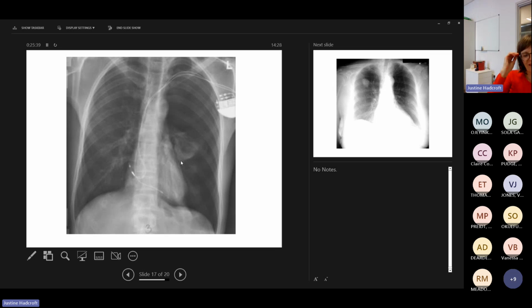What about this one here? Coming to the end now. I think we've got three more after this, but this was a slight curiosity, and it kind of comes back to the question: what's on this chest x-ray that's not present in nature, and can we see anything there?